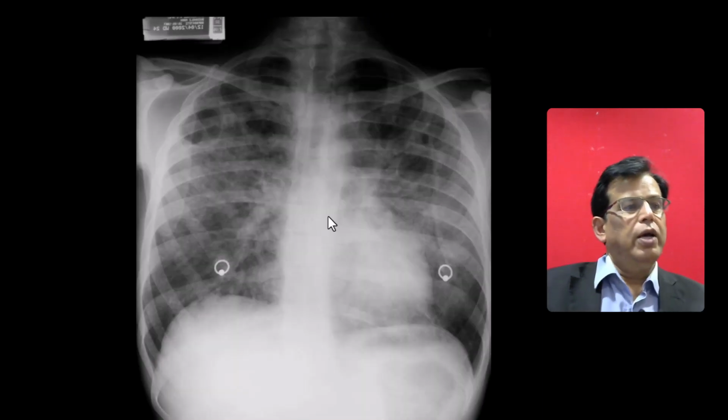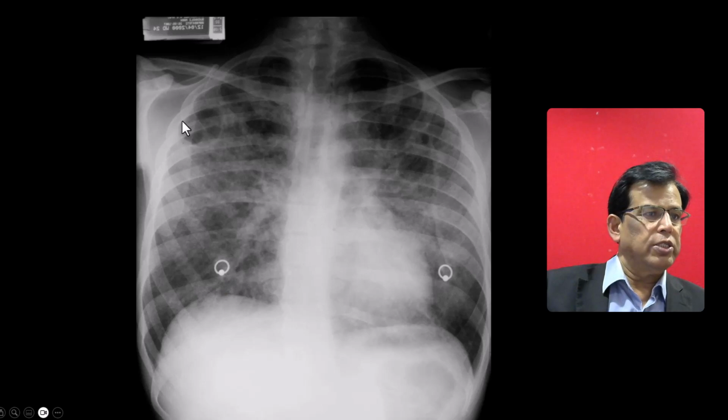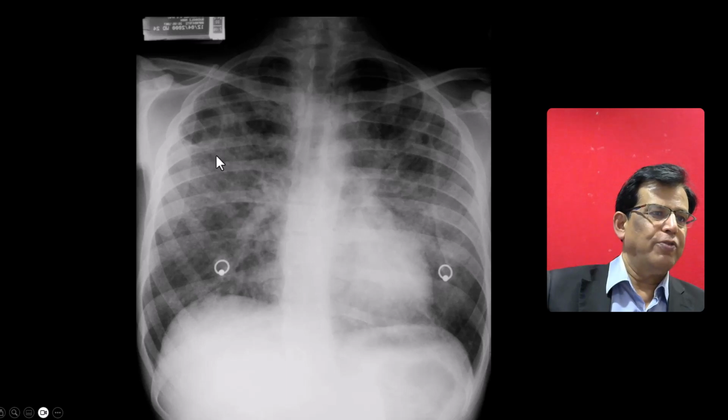And this one, I think this is a typical exam case. Everybody should know that if there is a nipple shadowing with perihilar opacities and cystic changes, this is PCP. Once you see it once, you remember next time. You get this only in exams. Not in normal practice, you'll not get it. If you get it in an exam, I'm lucky, I got PCP.